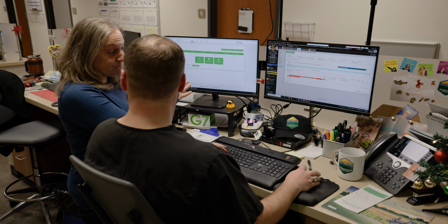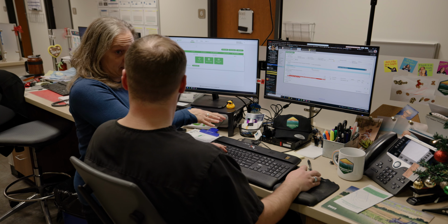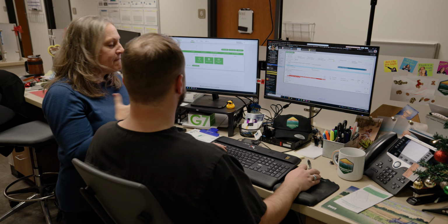That's the video where Amber Healy taught us how to read the CGM reports. So that was the Dexcom, and that was with a machine, with the CGM. What if I have my phone?